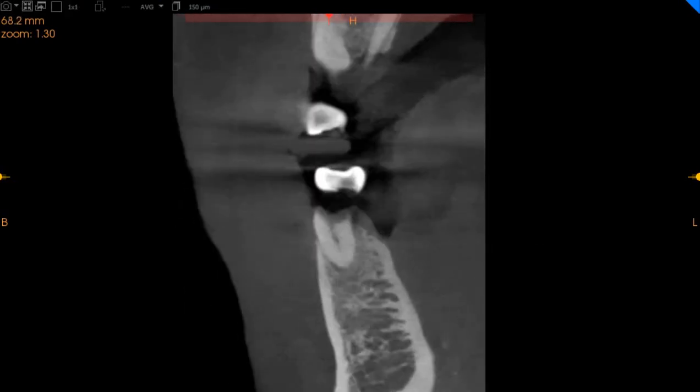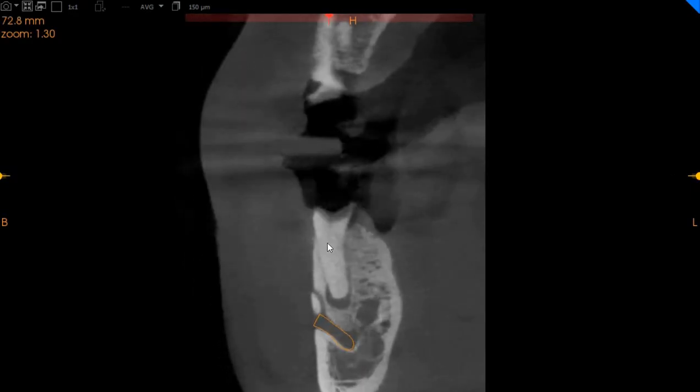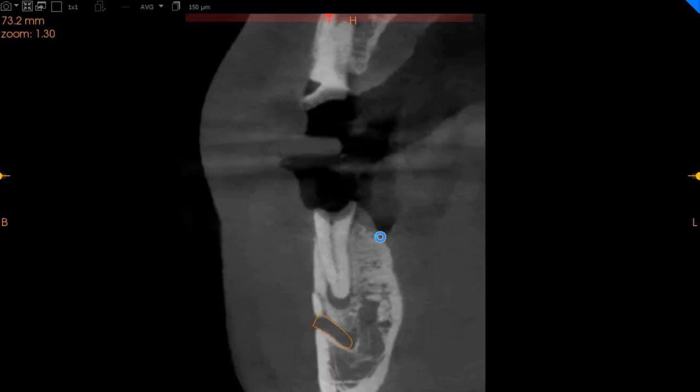Moving to the lower right 5, BTI, present periapical infection, very close to the nerve. 11 millimeters of ridge width with a good 18 millimeters of height. Again, this tooth can be extracted and an implant can be placed immediately.